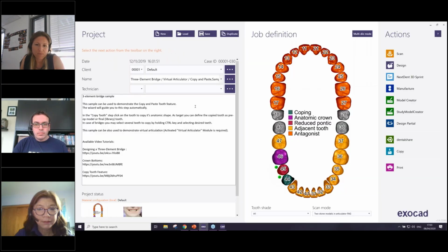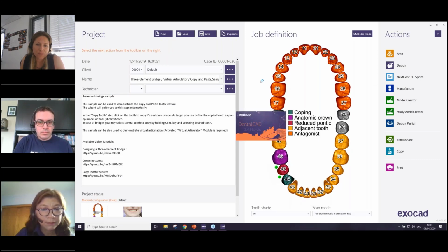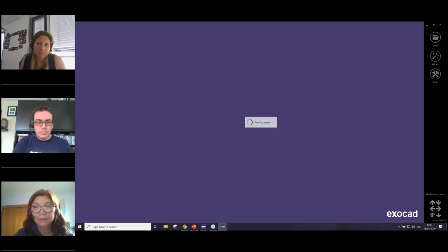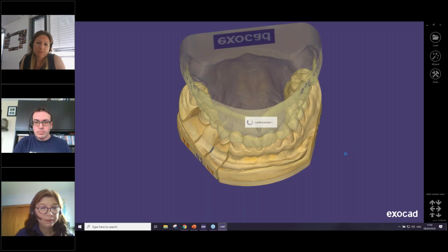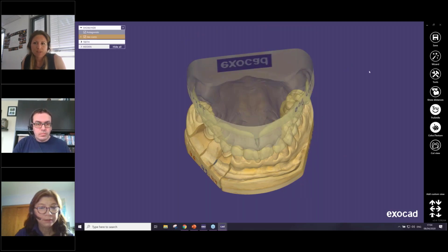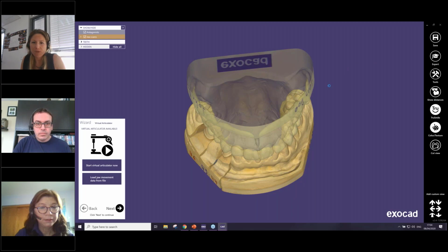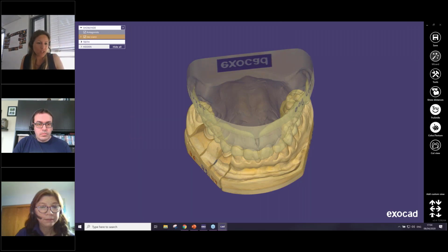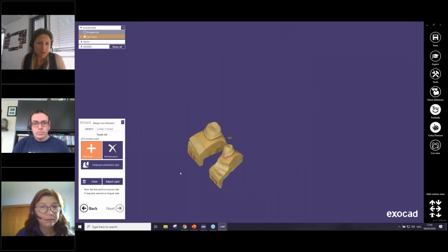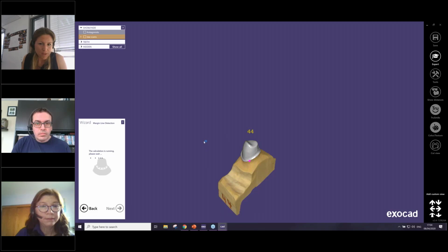Design. Okay, it's still loading. No, expert mode. So, oh no, I have to continue quickly.